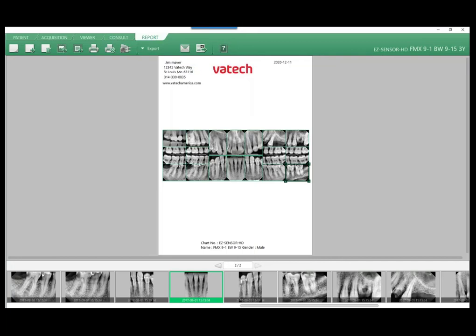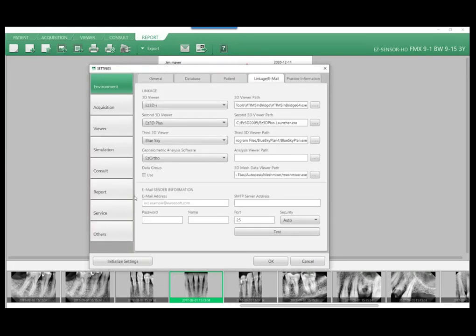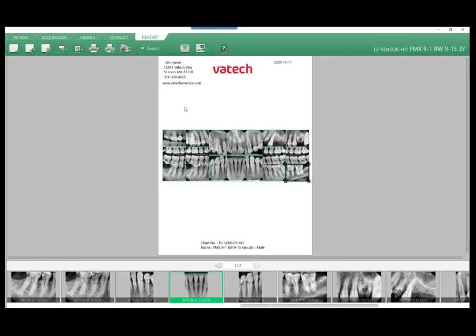Very important, if you weren't here to join us earlier, getting that set up. Paul, you would cover this, going over settings, linkage in email, and populating your email information. I always get my IT involved to get the password for the office, and then ultimately the SMTP server and whichever port and whichever security we're going to be using, or your email server does use on that. All right. One or two more things specifically for this, and one was saving reports to the database.